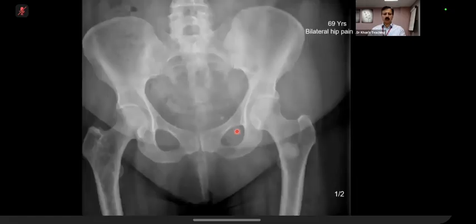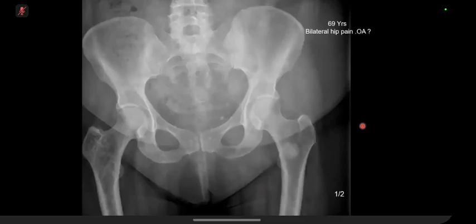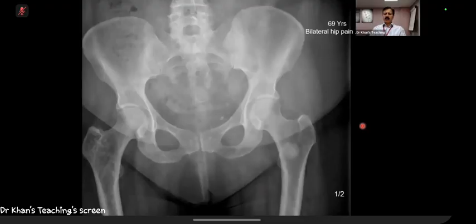during the session today. Okay, so with this background, candidate one, can you hear me, please? Yep. Okay, this is your case, and the patient has bilateral hip pain, OA. So we are talking. What are your findings? Because of time factor, I will guide you that I want you to see the left femur as well as the right femur. The findings in both of them.